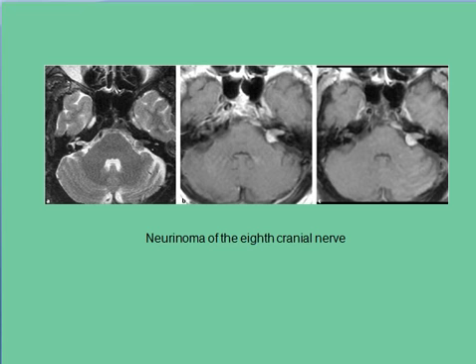Here, another mass lesion. This is the T2 and this is then after contrast enhancement. You see enhancement of the mass in the left internal auditory canal, consistent with a cranial nerve schwannoma.